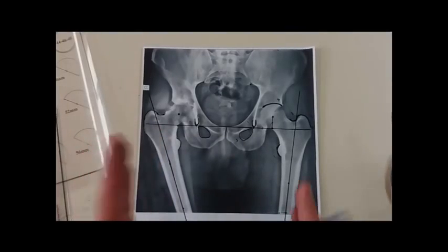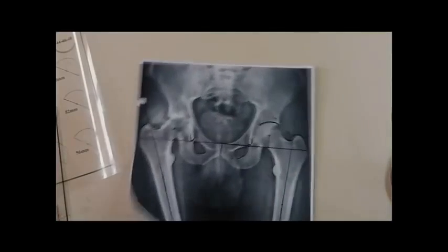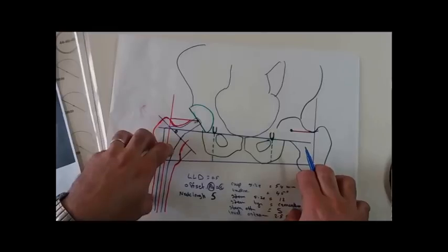If I cannot have both femurs neutral regarding hip adduction and abduction in the X-ray, I should do this maneuver of tracing and do all my measurements on this tracing paper rather than the original radiograph.